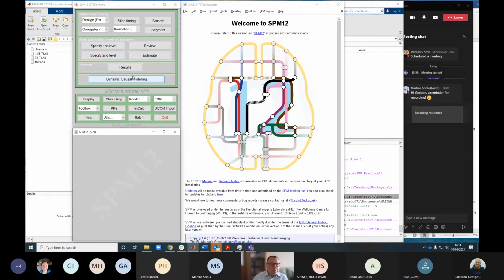And then at the bottom is the results button, which is the most useful one, which is the one that actually gives you the answer to your question. And the overarching question that SPM answers is where.